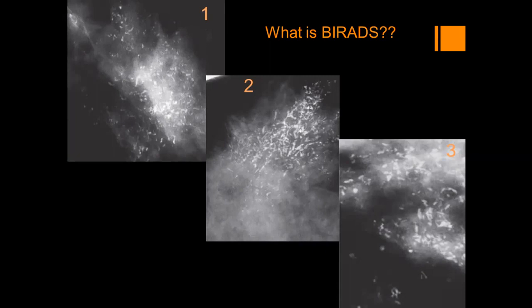So the 3 examples are at least BI-RADS 4C. If confirmed, this is the only one that seemed to be segmental. Appearance looks like segmental, it will be 5. But this might be segmental or regional. If it is segmental, it will be 5. If it is regional, it will be 4C. Okay. So all are examples of high-grade DCIS, or most probably segmental or extensive.